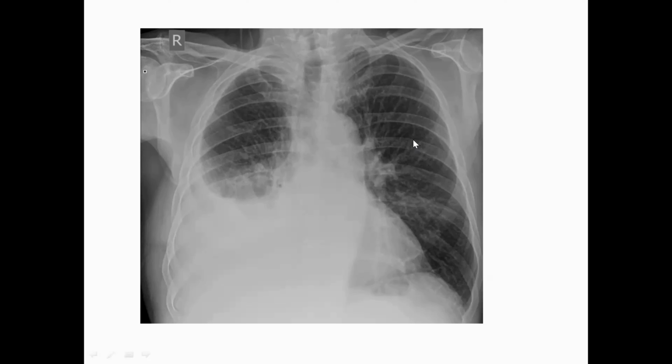Ideally, what is normal? In normal lungs, the lower lobe vessels look more dominant. Why? Because blood flow is gravity dependent. But when upper lobe vessels become prominent, this is usually due to pulmonary venous hypertension, when the blood backs up into the upper lobes, reversing the normal blood flow.